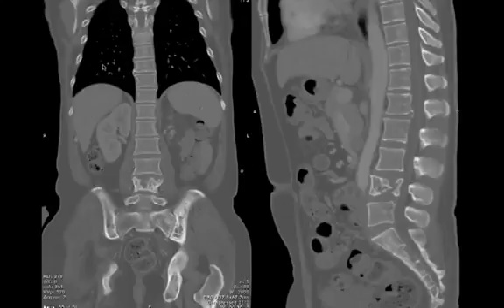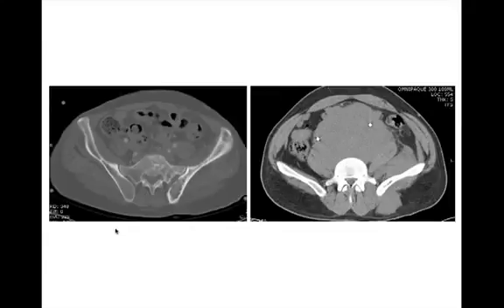Okay, so two CTs, a coronal and sagittal. So certainly we see the L4 vertebral body. There's a lytic process involving it. It's partially collapsed. There's also lytic lucencies in the iliac wing on the left and on the right. So a polyostotic process. So what are we going to be thinking about? Well, certainly, again, Mets, myeloma, depending on how old the patient was.